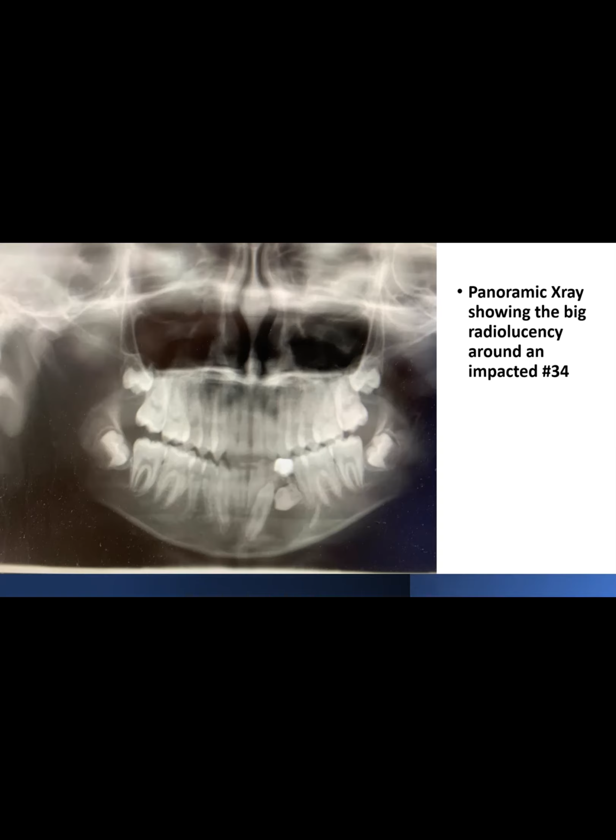You barely have a little bit of bone at the inferior border, right? If you look at it, barely anything, correct? Yep. Right, so thinning of the cortex there. Yes. And it's obviously unilocular and it's obviously corticated, correct?